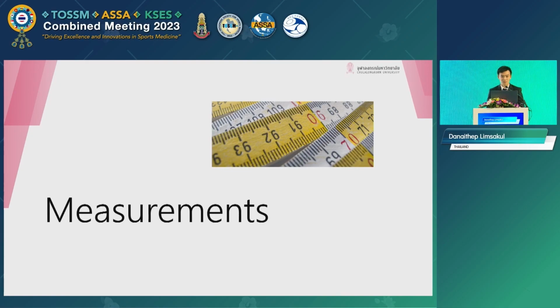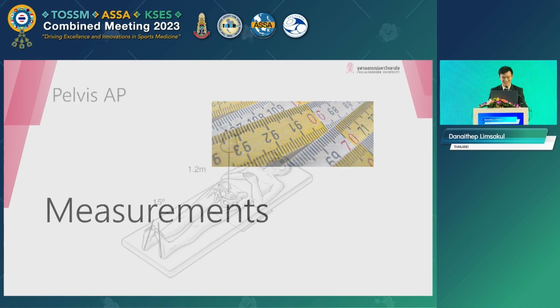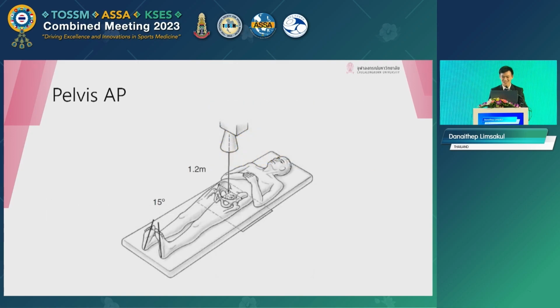I think some of you are familiar with the measurement of the hip, especially the AP view, or the anteroposterior. Here we have a musculoskeletal radiologist with us today in this room. Let's see if I made a good presentation.